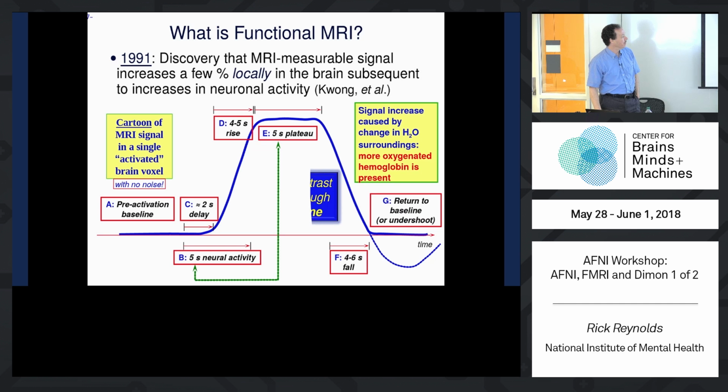Then there's a fall. There may be an undershoot. We have different basis functions you can choose from. Again, the choices will come back. Some have undershoots, some do not. Curves with undershoots are not typically the first ones we recommend, but you can use whatever you like.